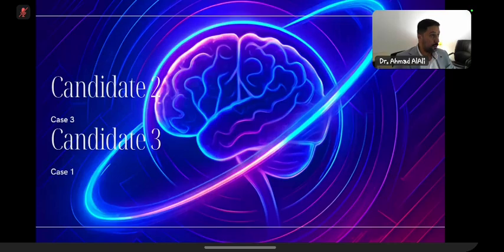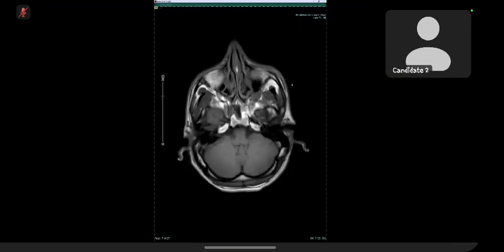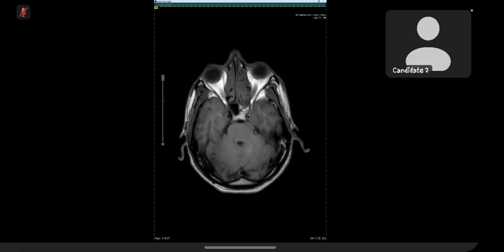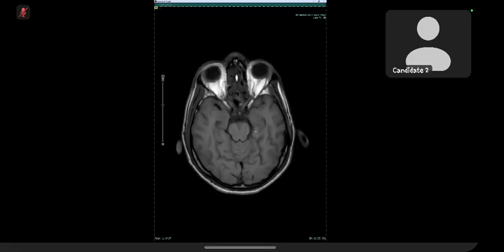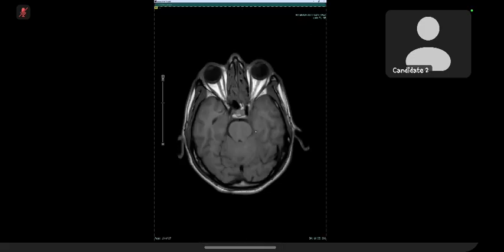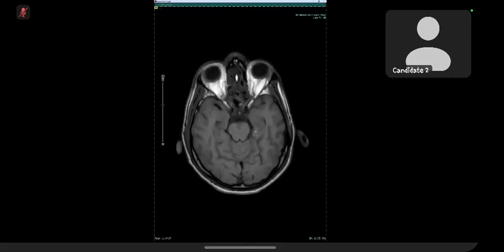I will start with T1 weighted images. Sorry, these are T1 weighted images. Can you spot them? Yes. Yes, please scroll through them and tell me. Presented with the T1 axial images. The patient presented with left-sided motion abnormality of the eye.